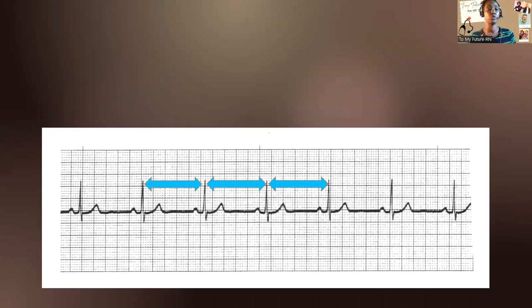If you have a caliper, you could walk the caliper through, or if you have an index card, DIY a caliper with an index card or paper, mark your first 2 R waves, and then march it down. I want you to notice these little red arrows are pointing to these notches above. 3 notches would indicate a 6-second strip. So we have 3 seconds from the first to the second notch, and then second to third is another 3 seconds. So this is a 6-second strip. This is important because any complex that falls outside of that notch should not be counted in that rate.